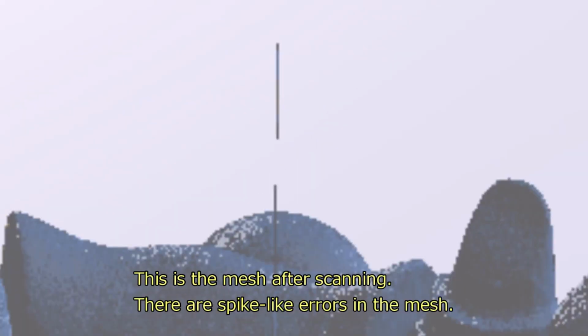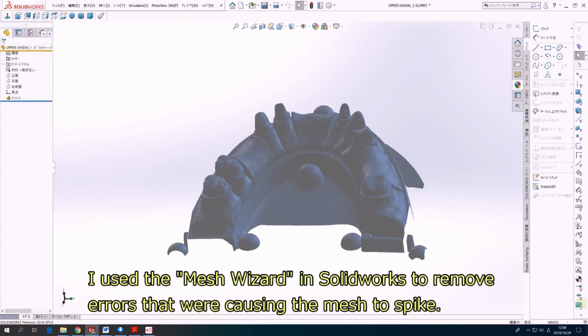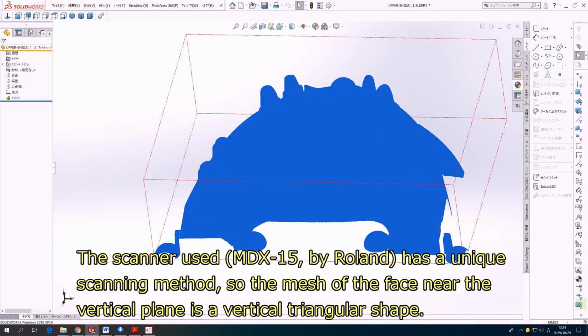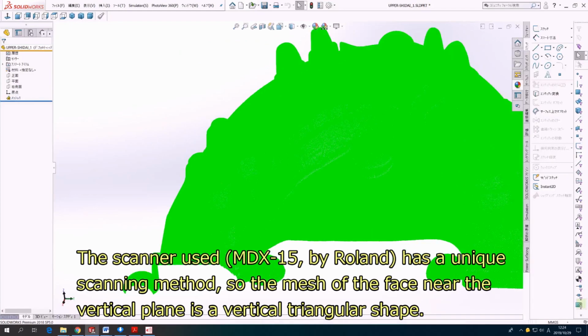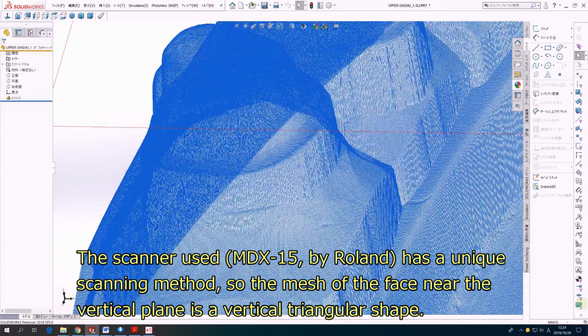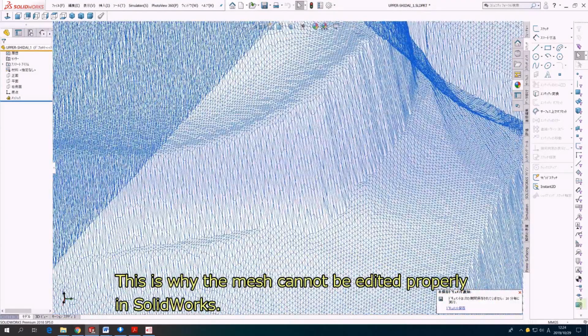This is the mesh after scanning. There are spike-like errors in the mesh. I used the Mesh Wizard in SolidWorks to remove errors that were causing the mesh to spike. The scanner used, MDX15, by Roland, has a unique scanning method, so the mesh of the face near the vertical plane is a vertical triangular shape. This is why the mesh cannot be edited properly in SolidWorks.